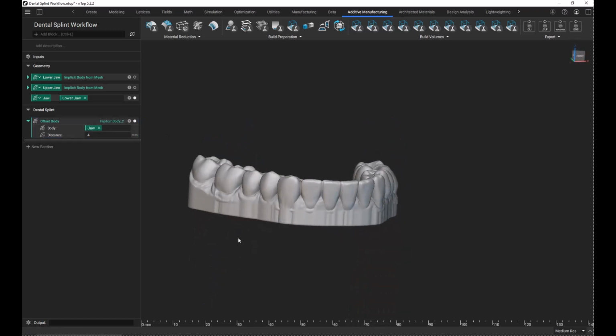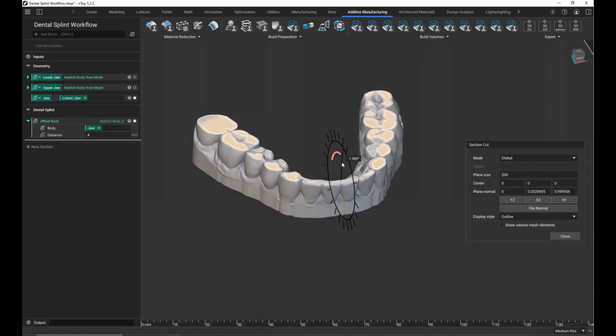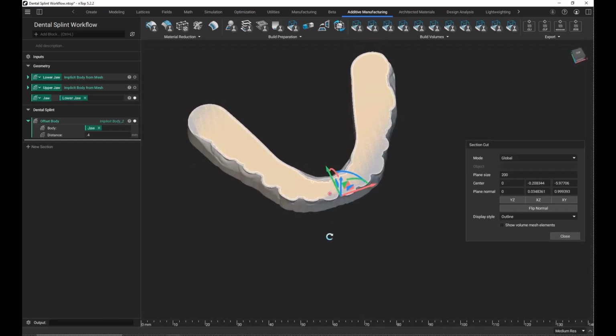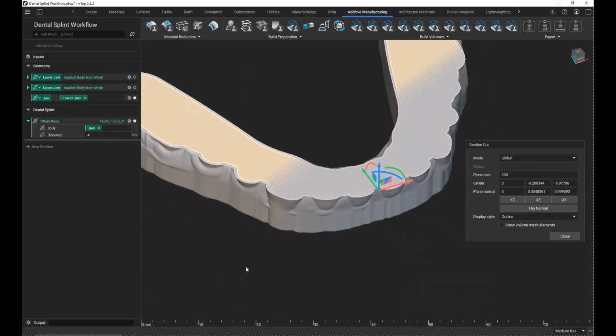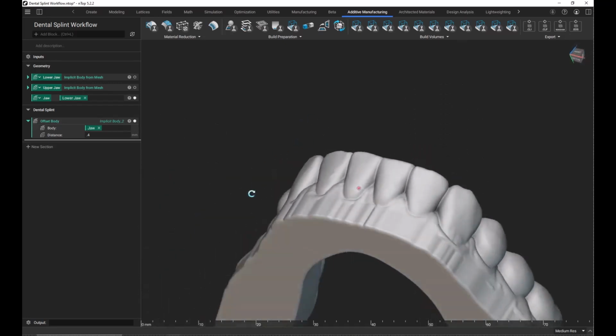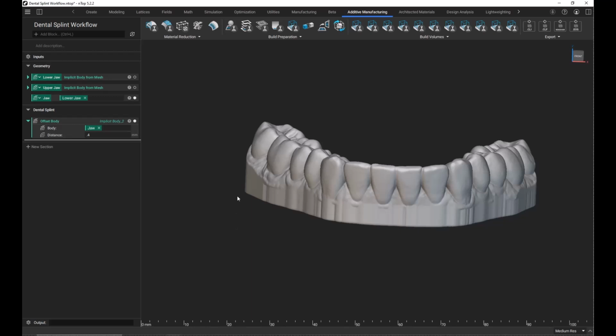And what we can see if we do a section cut, so I'm going to type X, is that it's just offset our entire geometry, like so. And there's a couple things that we want to do. So one, we want to have some type of potential gap that the user can input. I also, as you can see, this is fully covering our geometry. So right now we wouldn't be able to take this on or off.